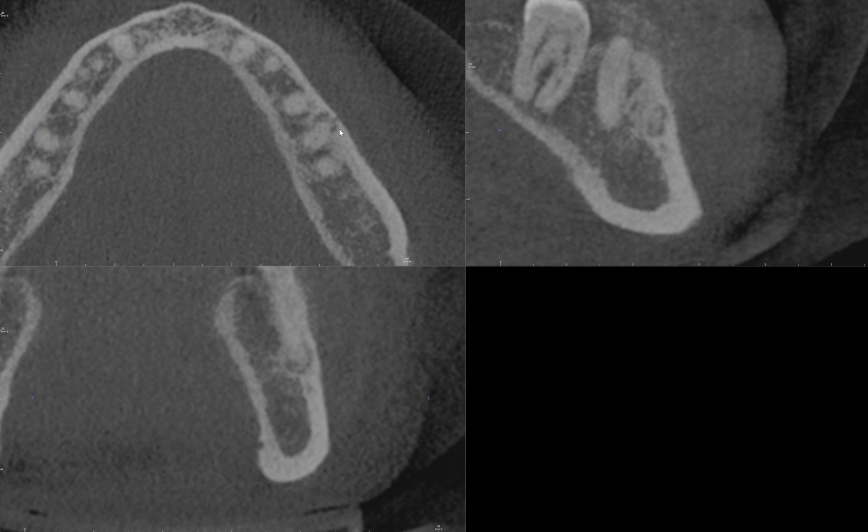Again, almost all of my cases are coming from dental students, dental hygienists, as well as practitioners that practice outside of school, referring these cases to me for my opinion. So if you can learn from these, that's great. And that is my goal, trying to improve your diagnostic skills, radiographic diagnostic skills.